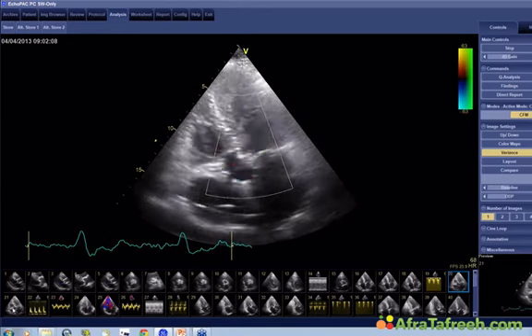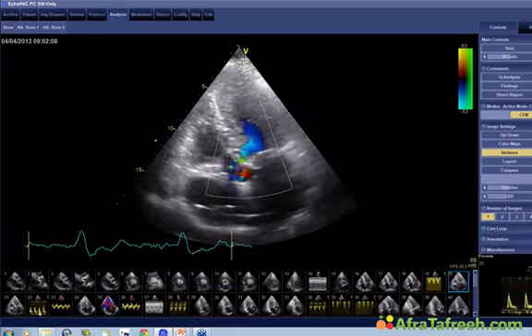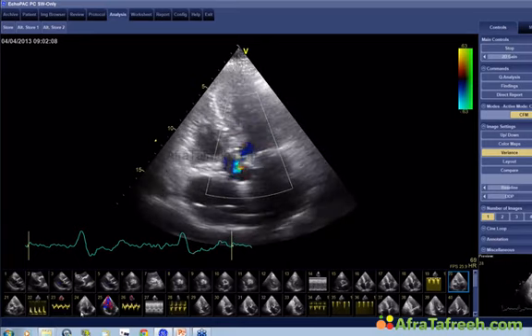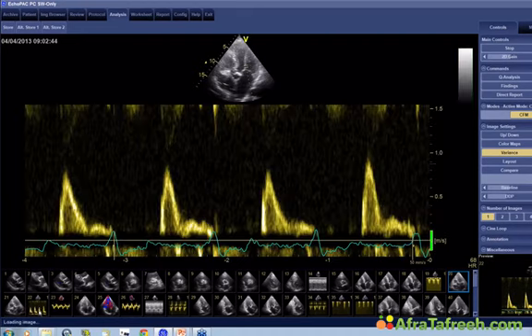because what I personally do, when I have a patient with aortic stenosis, is I do that last. The reason is that you tend to forget to do the rest then, and the rest is very important as well. All the things that you have to look at in these patients, like left ventricular hypertrophy, the degree of aortic regurgitation, diastolic function, could be forgotten if you focus immediately at the pathology that you're looking at.